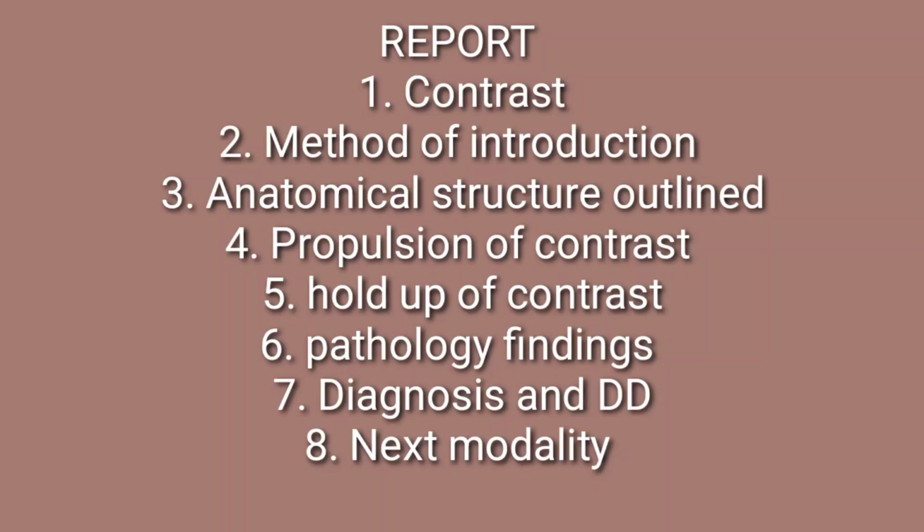After all this, you must mention the propulsion of the contrast, the way it is passing through the organs, and then whether there is any hold-up of contrast at any point, or a leakage of contrast at any point, or whether there is any pathology, any diverticulum, or any filling defect you are able to see. So you must mention the pathology. After all that, you should have your own diagnosis.